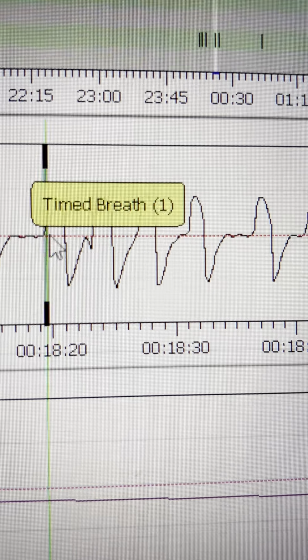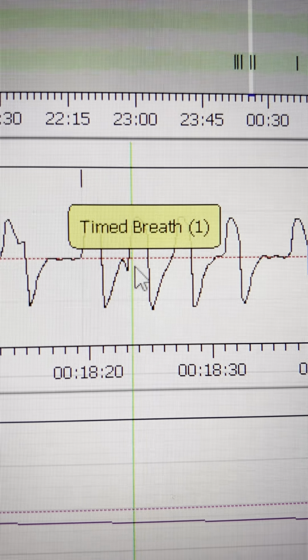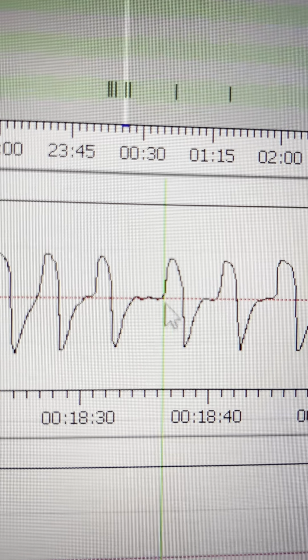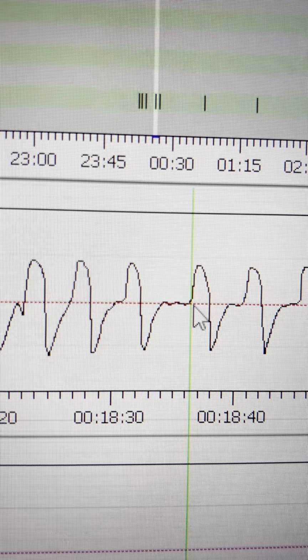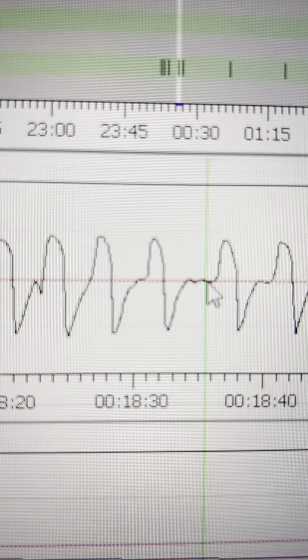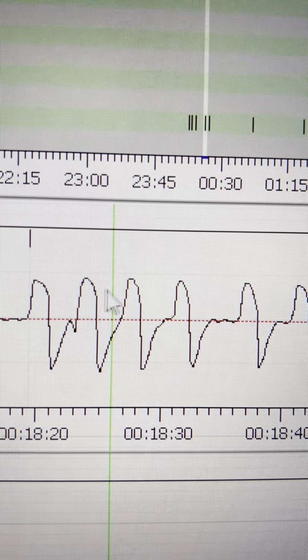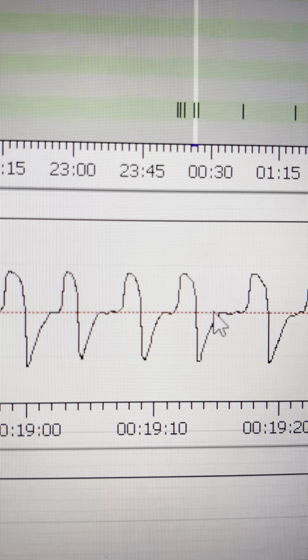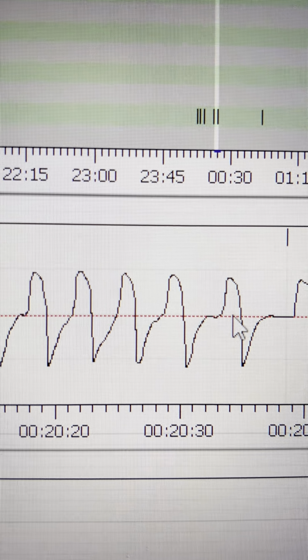And furthermore, here you can see the cutoff happens again. Weird breath. Try to exhale again, and then I can inhale again. Here I wouldn't be able to tell, but this could be more of me just trying to stabilize. And then here it continues.